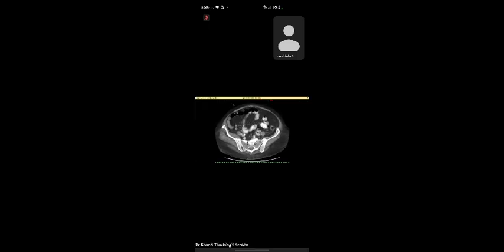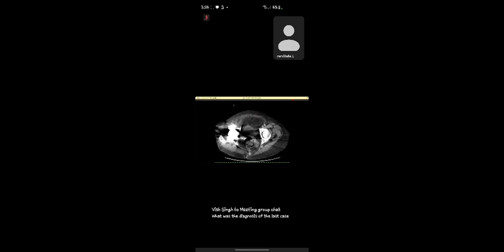Now it's working, alhamdulillah. I am presenting an abdomen CT with contrast. I will go through the study before comment. I can see there is a pelvic fluid collection, a retroperitoneal fluid collection seen around the rectum. This is associated with an abscess, a fluid collection, regular in shape with air foci.